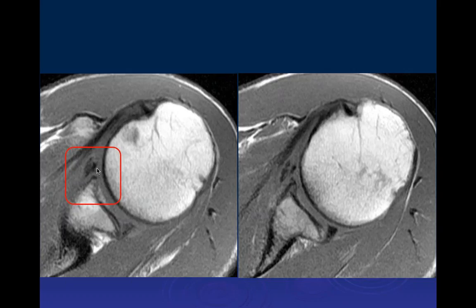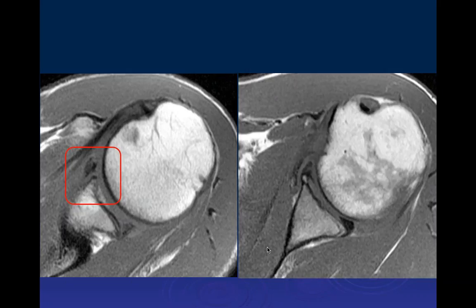I'd really be concerned about either an acute strain or injury to the middle glenohumeral ligament or chronic tendinosis. This could be the middle glenohumeral ligament more likely, or less likely the anterior band of the inferior glenohumeral ligament. We'd need to follow it down and see. Maybe the two are separating here, but you would really need to follow it all the way down to see where they go. And there we can see the two little structures. If we continue farther down, what are we seeing here? It's continuing further down, seeing the calcification of the anterior inferior labrum.